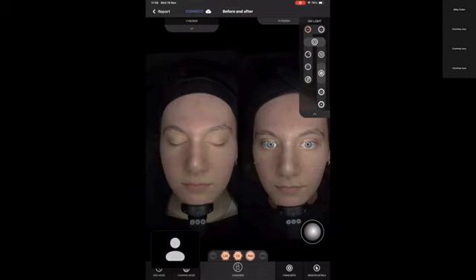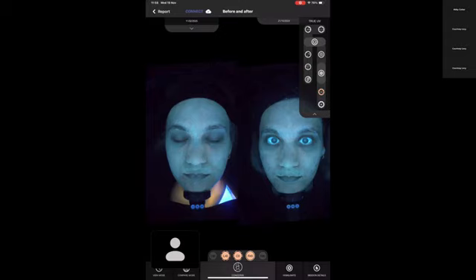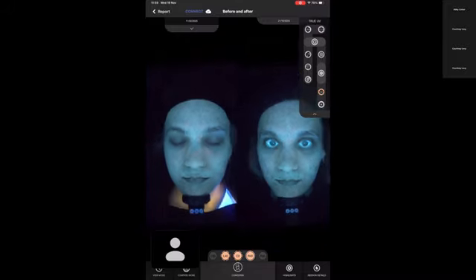This is a really good way to point out two things. The treatment, the photo she had there, she wore a white t-shirt. And when we go into the UV and Woods, you'll see how that really impacted the light, the photo quality. And the earrings have not been removed, and this also takes away. You can also see that her headband wasn't placed on properly. She has her hair popping out. But basically, I want to show here the difference between the before and after, that she's had a reduction in the amount of P. acnes and oiliness of her skin post the treatment.